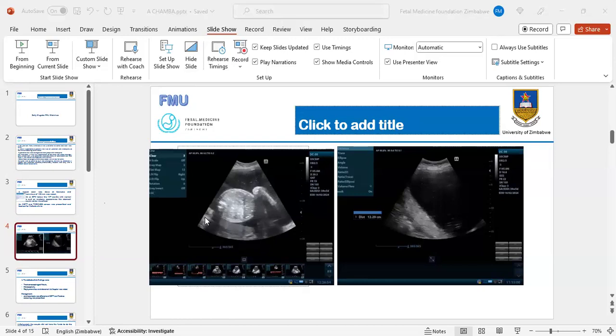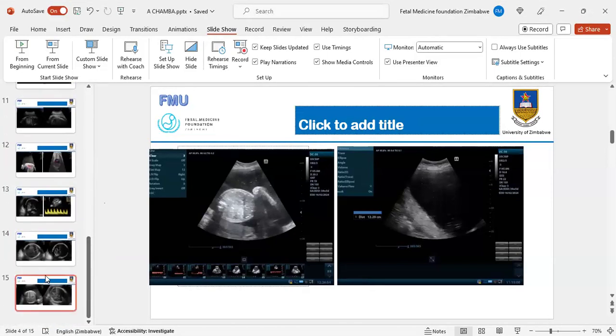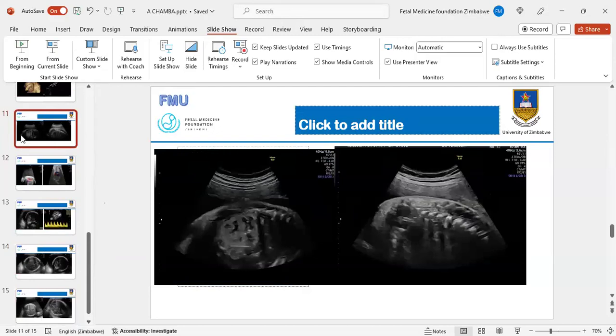All right. Do you mind if you go to the image where you show the kidneys? I think there's something which is not right with those kidneys, which we can look at. I think there's an image which, yeah, that one. So if you look at these kidneys, you can see that these kidneys are enlarged and a little bit more echogenic. These are some of the effects you will see with losartan. I think it's more pronounced on the image on the left there. So these are some of the effects of losartan, which you have to be aware of.